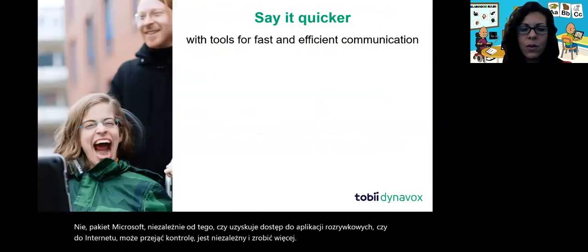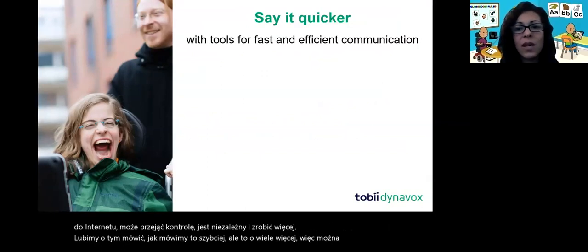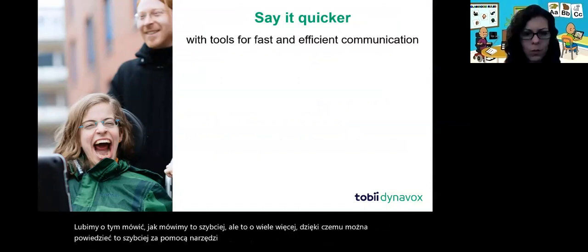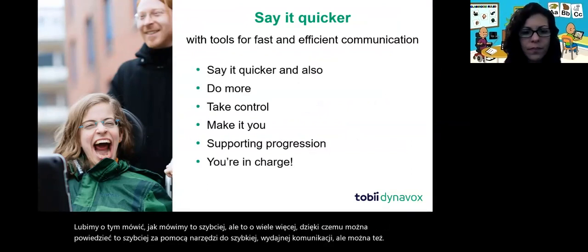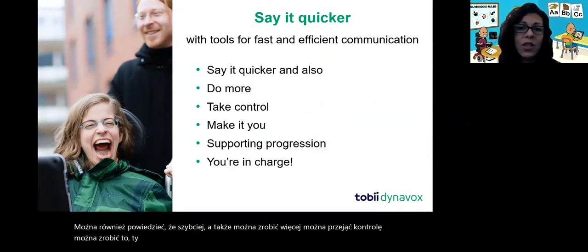So we like to talk about this as our "say it quicker," but it's so much more than that. You can say it quicker with tools for fast, efficient communication, but you can also do more, you can take control, you make it you. So the device is personalized, and it's almost an extension of who you are in the way that a device can be.